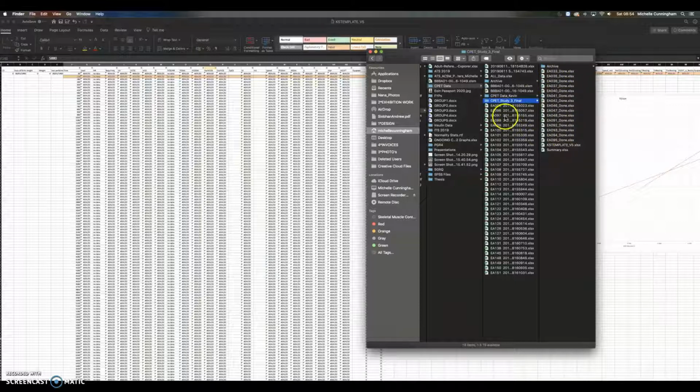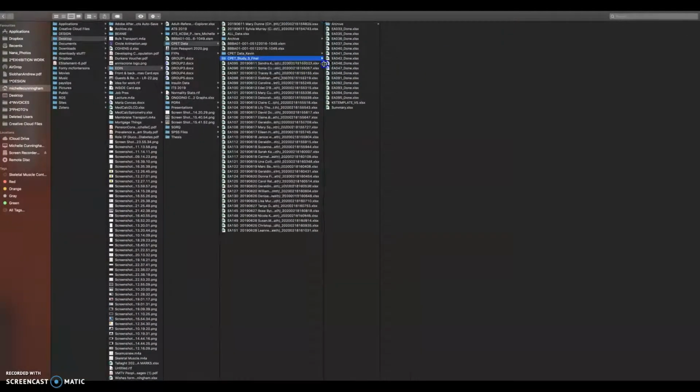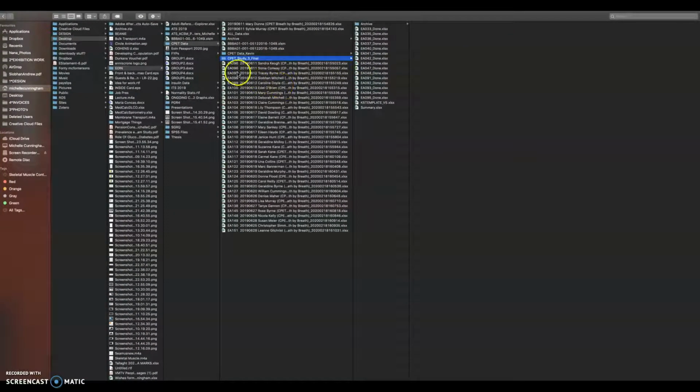I've done up to 95 here, so I'll go for 96. So these are the files. These here are the files that I've yet to do. There's a few more I've got to add in there, so these are the ones I'm working on for the time being. I might give you a few of them in the 20s, these ones here, 121 to 127. That'd be great if you got a few of them done.